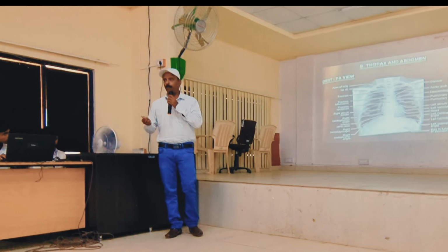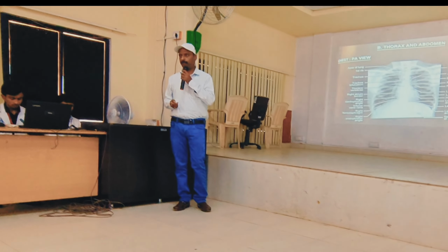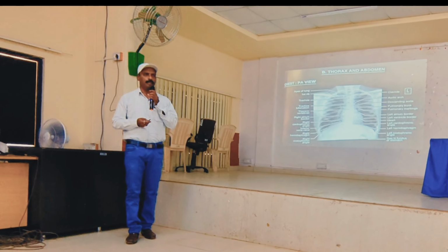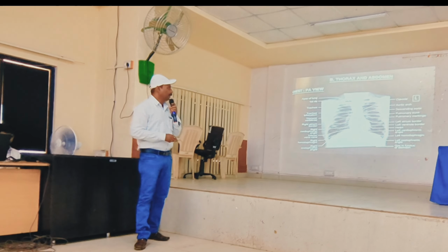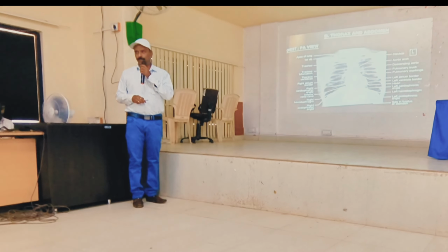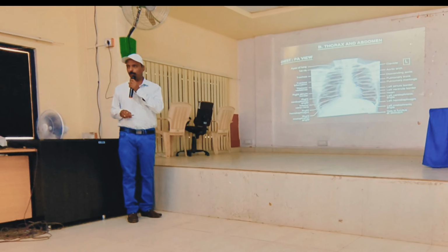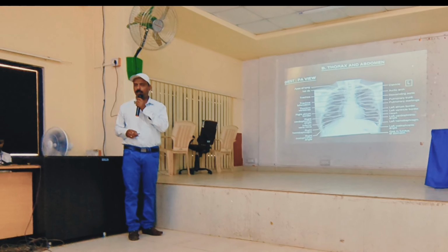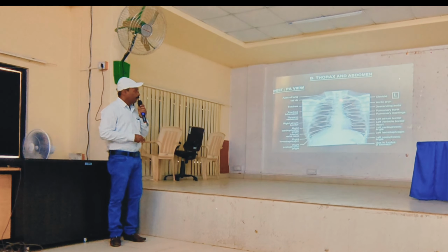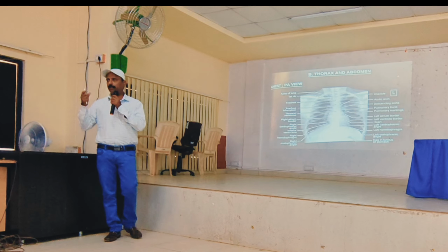See, these are a few important points. I'm going to show the plain radiographs, where you can see and what are the things you have to remember. Whatever I have told, the region you have to see first. So instead of going to the labelings, as you already know all the parts and locations of the structures or the organs of the body, first I am going to give you the guidelines to read and comment on the PA view.